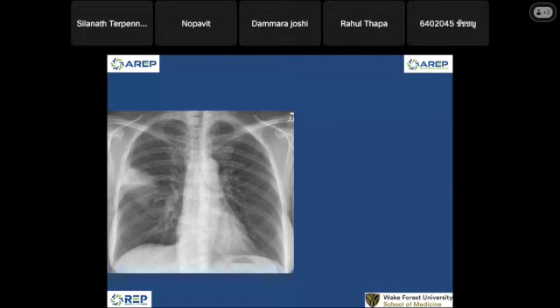If this is a 65-year-old man and a smoker, I would say, I'm not sure if this is pneumonia or lung cancer hiding in the pneumonia, because they can coexist. So in an elderly patient, I would say, okay, I see here it is likely pneumonia. Suppose a 65-year-old comes in with no symptoms at all. This is definitely cancer. A 65-year-old smoker comes in with symptoms. This can be pneumonia, can be cancer.